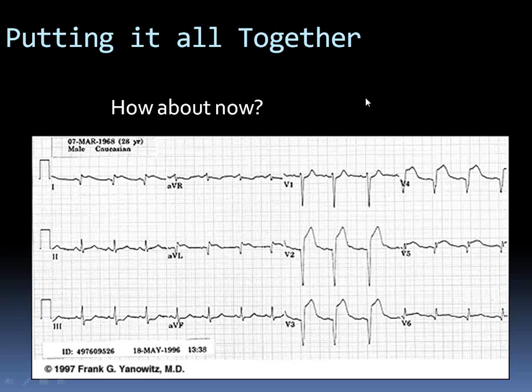So it looks like Fatima just sent me something. I think her mic is probably not working. But she said that you can see ST elevations in lead V2, these sharp elevations, right? As compared to the baseline, these STs are very much elevated in V2, in V3, also in V4, and also in V5 as compared to the baseline.